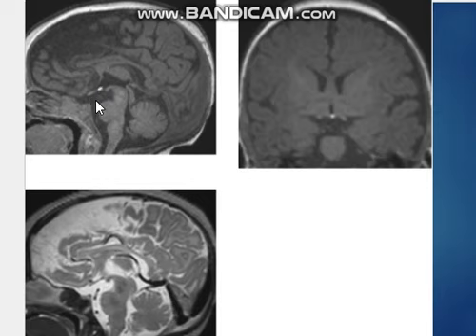If seen at the expected location of the apex of the pituitary stalk, okay, this means that there is no pituitary stalk and the posterior pituitary is migrated at its apex to be connected with the hypothalamus. Okay, so in this patient, the posterior pituitary is functioning and secretes the posterior pituitary hormones. Okay, so the hypopituitarism here is limited to the anterior pituitary hormones. Okay, not to the posterior pituitary hormones.